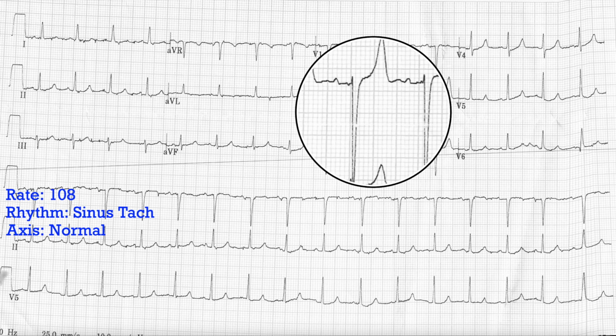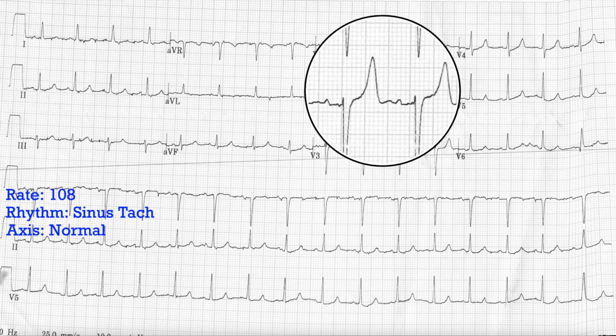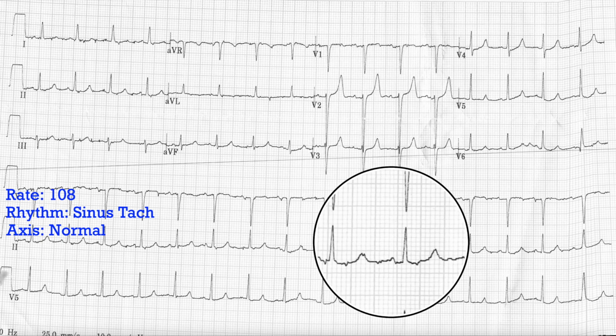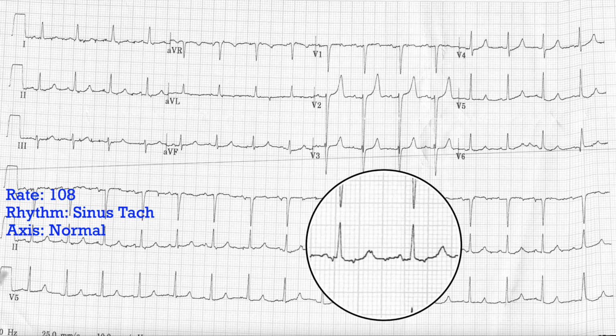And then let's look at our QT interval here. Again, between the R waves, and you could do it on this one because there are little R waves there, but you could do it down here as well. The R to R interval, as a broad cheat way to do it, the T wave should finish before halfway between the 2 R waves.